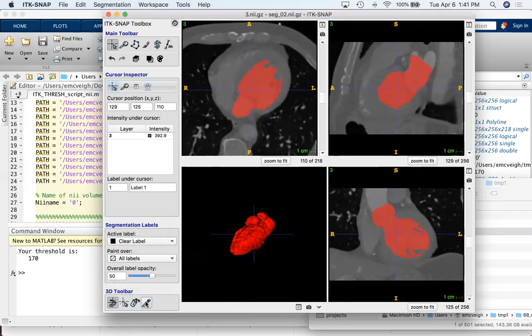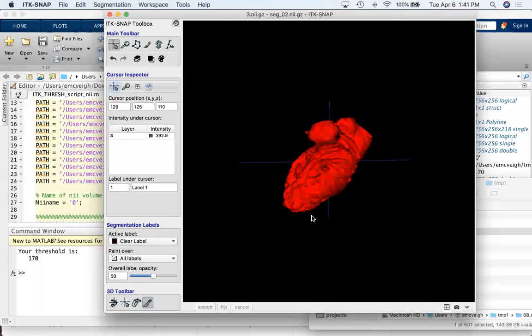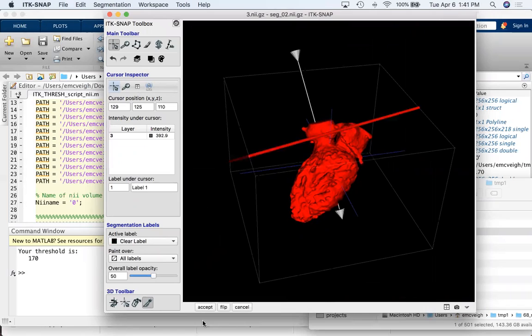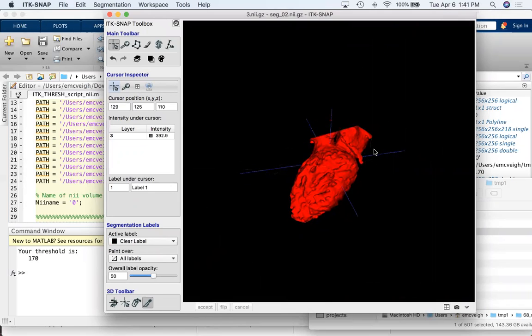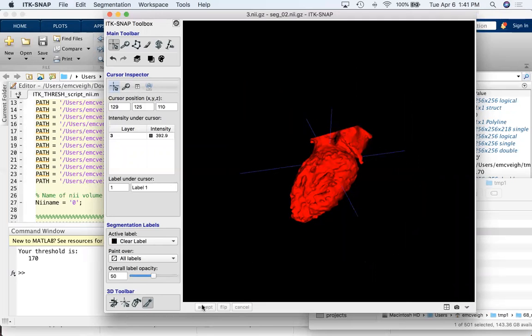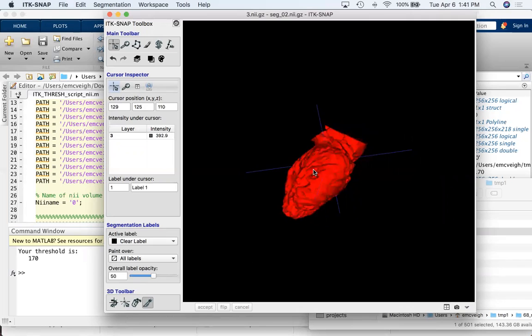And now we're going to clear the label, go to the pen. This is just something I'm starting today. I usually don't do this, but I think it's a good idea. Which one? Cutting those? Yeah, just cutting this off so it grows again, just so they don't grow into enormous things. If we don't cut them off each time, they're going to grow into huge things. Okay.